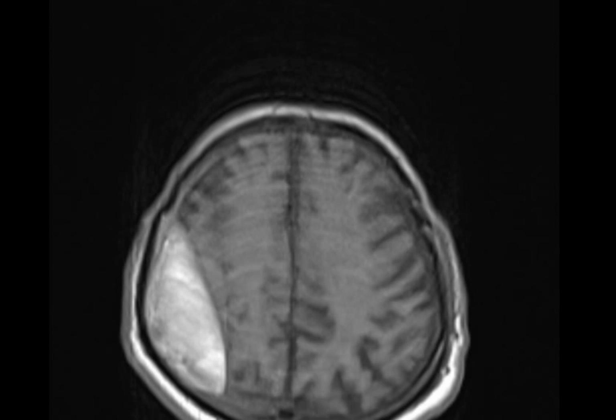So what do you think this lesion is? Mostly it's a hematoma. Which kind of hematoma? Extradural. In a 99-year-old patient, what suggests the cause of the hematoma? Maybe trauma. Most likely it's traumatic. Extradural is almost always traumatic.